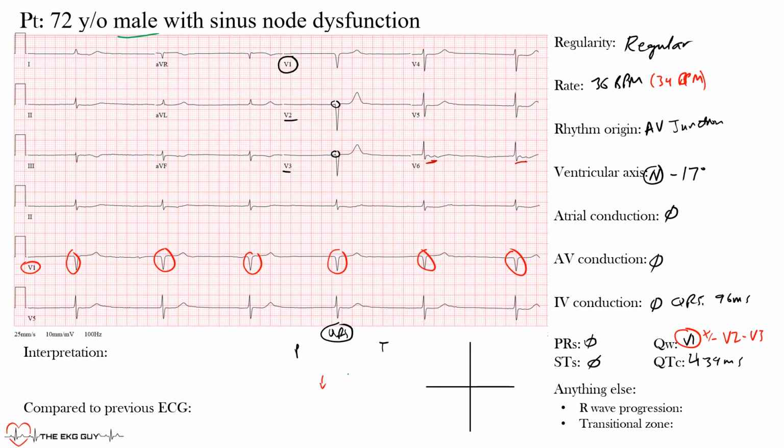Now normally not until around 500 milliseconds do we get a little concerned, and sometimes the machine will give us an alert, if we're in the hospital, of a patient that is having a more prolonged QTc interval, because this could put patients at risk for torsades, which could be a life-threatening arrhythmia, or ventricular arrhythmias.